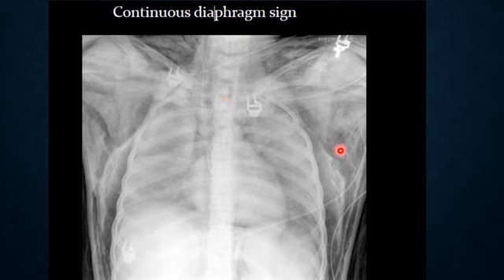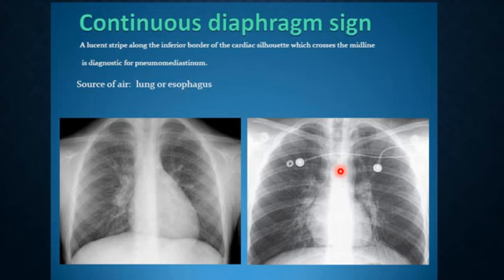This, you can see here, it's lucent. It's more blackish in color. Why? This is muscle, it should not be black, it should be white, but there's air in the subcutaneous soft tissues, as Dr. Serbes said, which indicates surgical emphysema or subcutaneous emphysema or whatever you call it. Yeah, the lines, striations, are due to the muscle fibers.